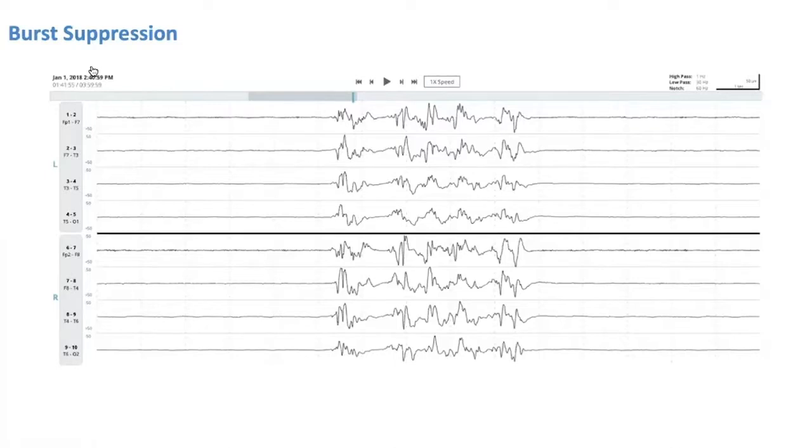So part of this, the answer is going to be one of experience and time, and part of it is going to be a matter of trying to approach it more simply. I think the simpler way of going about it is looking for some consistency within the burst. If you're seeing the same wave recur, the same shape recur within the burst several times, and I see it here, the similarity of 5 or maybe you can say 6 times a similar shaped wave is occurring, that raises my concern that this is an abnormality that's epileptiform. And so seeing something that repeats is the concerning part.